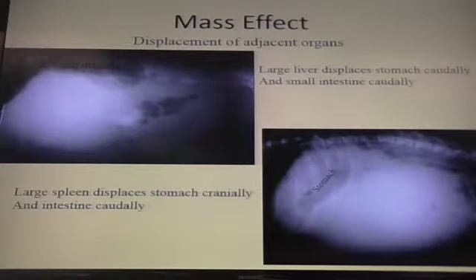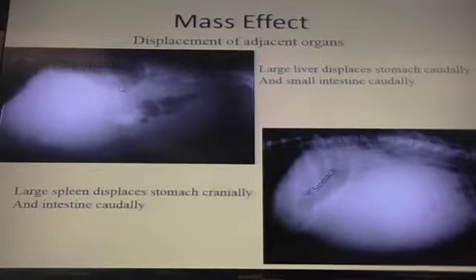Liver is going to be your number one, because that's where the liver lives. What else lives there? Pancreas, stomach. Now, why not spleen? Because the spleen does not displace the stomach and bowel loops caudal. The spleen is located caudal to the stomach. So you would not put spleen in your differential here because the spleen doesn't live there. The spleen lives caudal to the stomach.